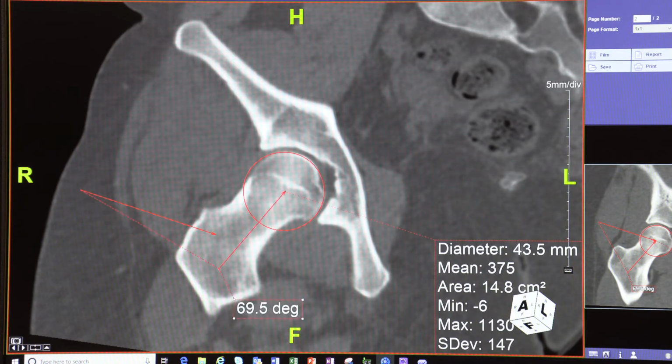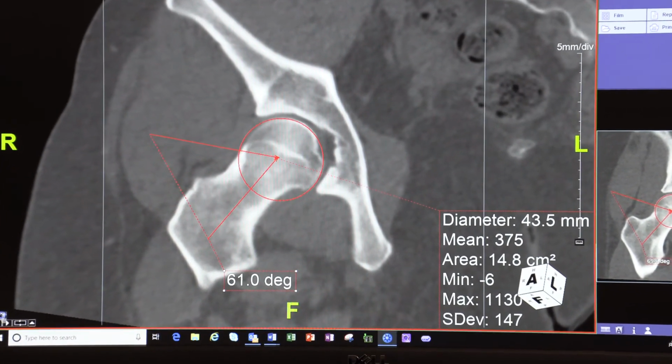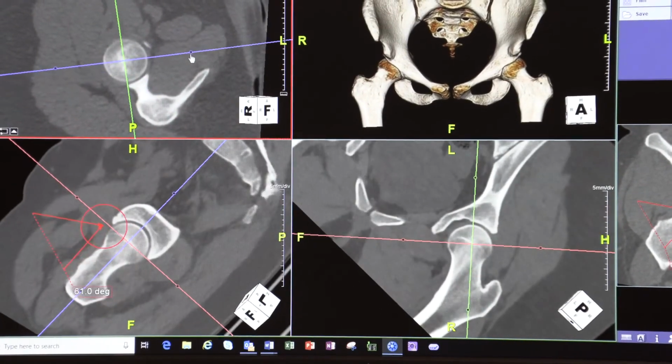So we go to the center, which is this. Bring it right about here. Then bring this line here. Now the question is, where are you going to get it? Well, it seems like it should be here, it's getting out right about here. So that's your physeal scar ending, and this is where it's getting out. So it's about 61 degrees at this spot. So you can take another image there, and then for the 3 o'clock, it's going to be horizontal like that.